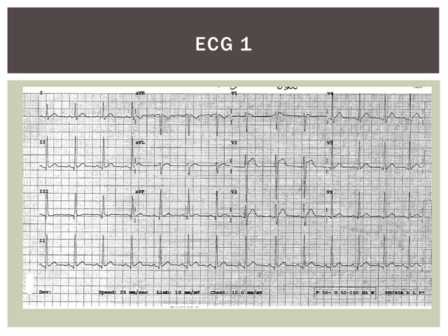So he's in sinus rhythm. But it does look a bit funny here in the septal leads. There's this ST elevation pattern from sort of V2 and V3. Not classically horizontal, but still a bit worrying.